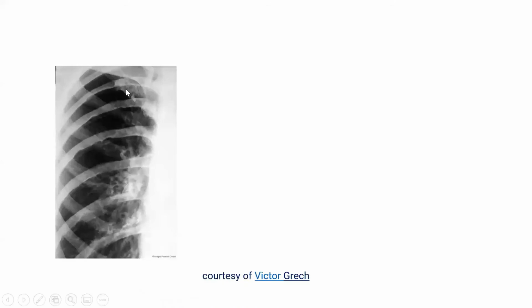Now, what is this? Ribs. I'm showing you the ribs. What do you see in them? Notching. Very good. Rib notching. So this is a sign of coarctation of the aorta. And why? Why in coarctation of the aorta do you have rib notching? Due to collaterals. Yes, because of the stout, prolific collaterals compressing on the bones from inside, leading to this kind of notching by compression effect.